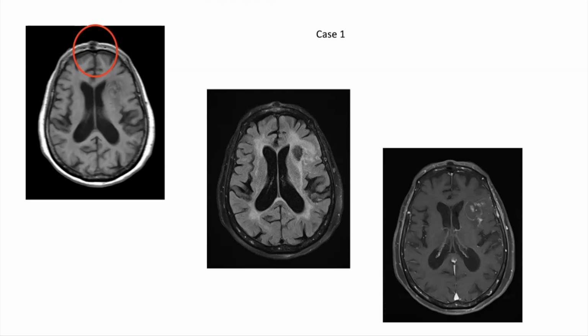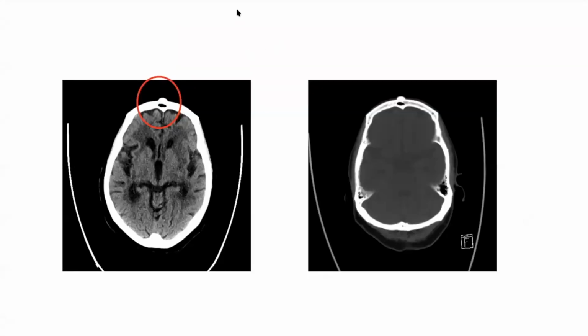But my experience has been that you can get pretty far afield if you think you know what the CT scan is going to look like. It's not a very high bar to get over, so I want you to consider getting a CT scan whenever you consider the finding that you see on MR. So now I'm going to show you the CT scan, and I'm going to ask you what you think this represents. Here are your choices: fibrous dysplasia, enchondroma, osteoma, intraosseous meningioma, and intradiploic epidermoid.